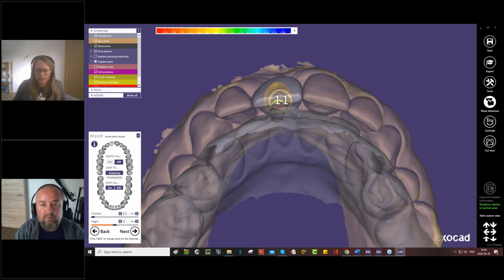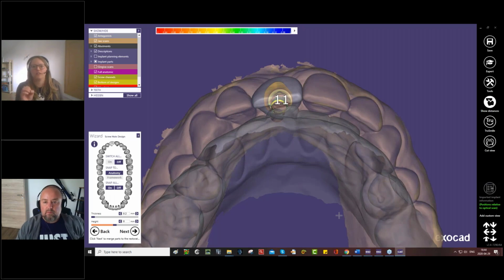Well, sorry. It is possible to make a marker on the guide that correlates to the implant connection. So, for instance, if you place an angled abutment, it's very important that you know exactly how the implant should be put in. In that case, when you place your implant and your angled abutment, you rotate your implant so that it's sitting like you want it.